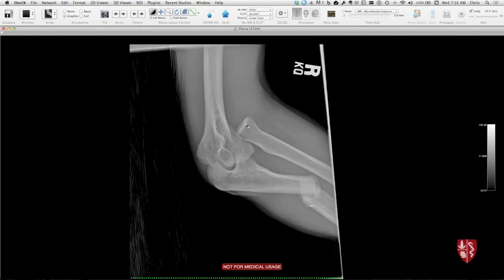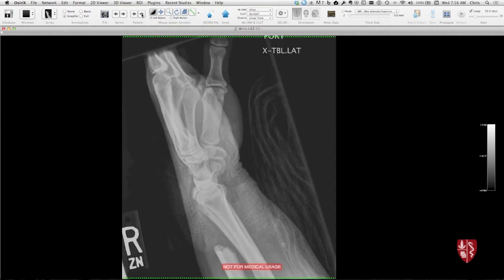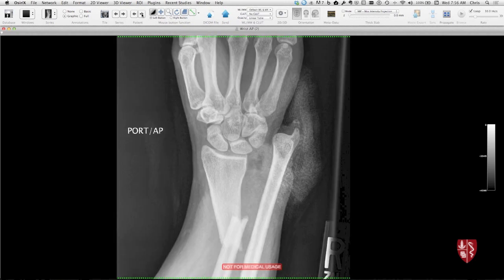Let's see on the other view here. So these kind of ring structures like the forearm and to some extent tib, fib, pelvis, if you have one fracture, you have to think about another one occurring at the same time. So if you look at this patient, this is the other Italian. Galeazzi, excellent. In this case, the fracture involves the radius. It's typically the distal third or junction of middle and distal thirds of the radius, and dislocation of the distal ulna. So they're sort of opposites.